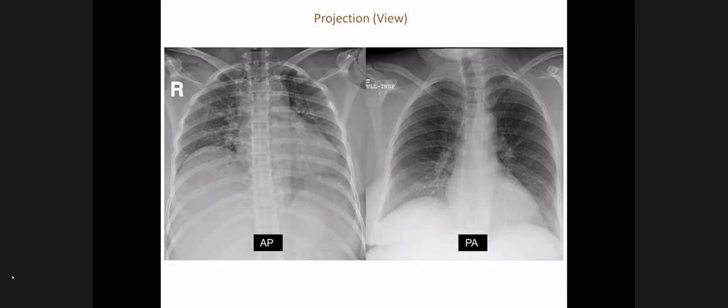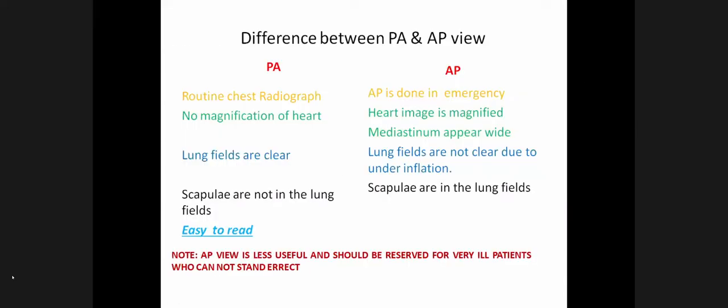This is the modality plain X-ray, and the view is frontal. You have to keep this in mind, especially for the theoretical exam of the block.